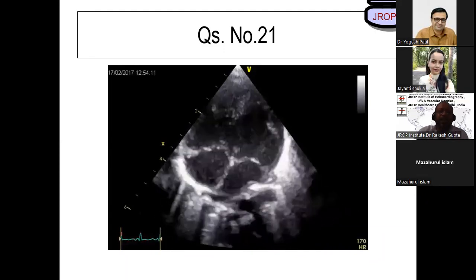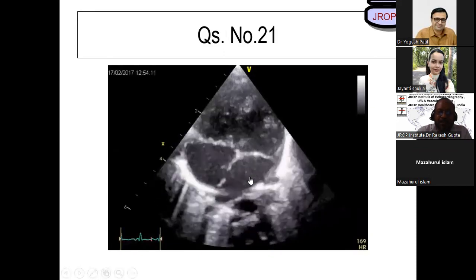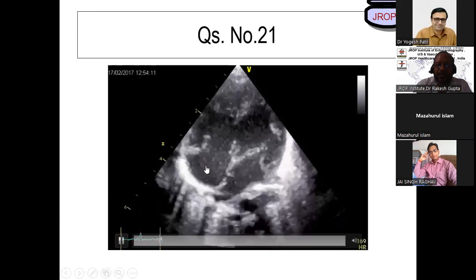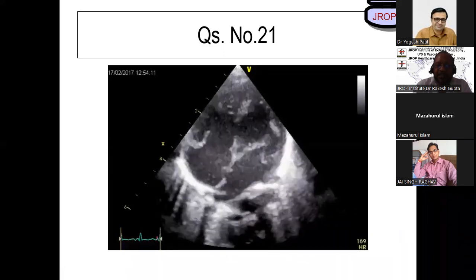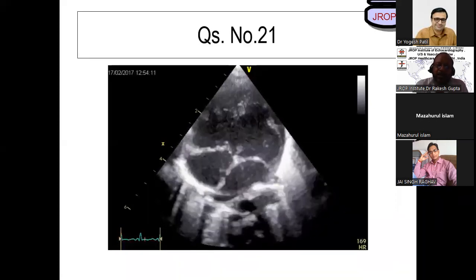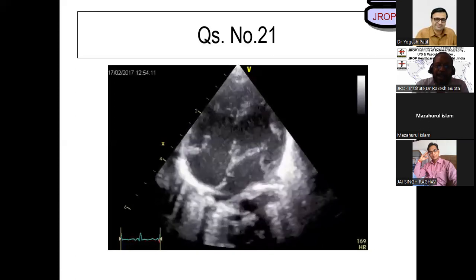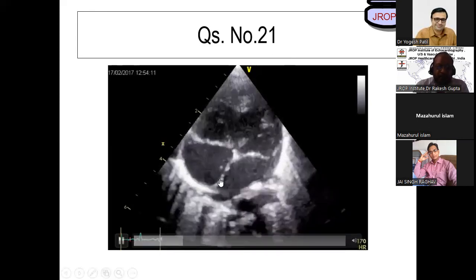Great. Everybody look at this small atrial septal defect over here. And in this patient, the RV has already become bigger than the LV, and the RA has become bigger than the LA. So this was a catch for this patient. RA is dilated. RA could be dilated because of raised pulmonary artery pressure, but that is how the catch was. RA is dilated and we could pick up this. Correct? Good job done. 4 out of 4.